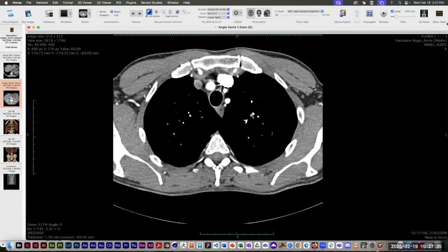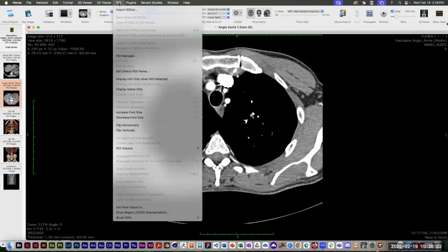The one thing that I found this is really useful for is the lungs, because the lungs are solid black and they are very, very distinct from everything around them. And the lungs are continuous structures. Each lung is a continuous thing, and they're actually connected to one another also because of the trachea and the bronchi, which are also black.